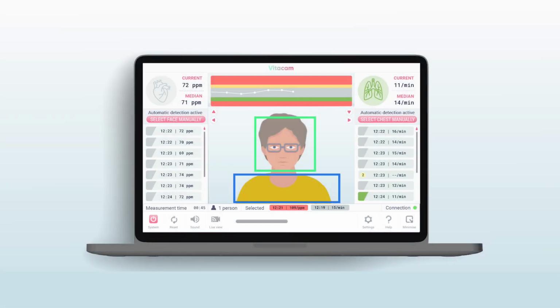If one of the vital signs is deemed unnecessary, individual elements can also be hidden using the Minimize List and Minimize Trend buttons. Elements can also be completely hidden from the UI by selecting Settings, User Settings, Vital Mode.